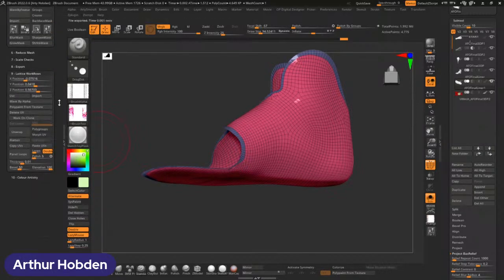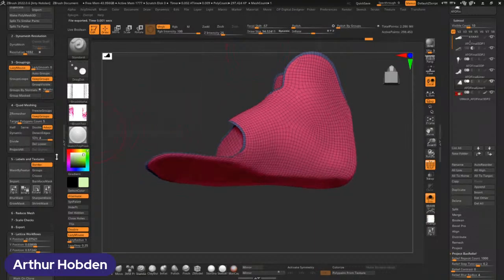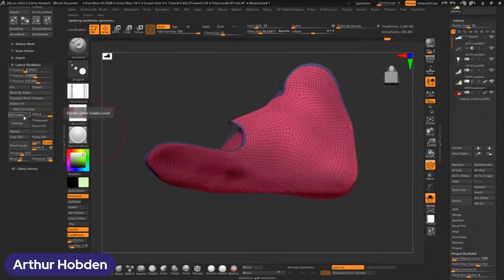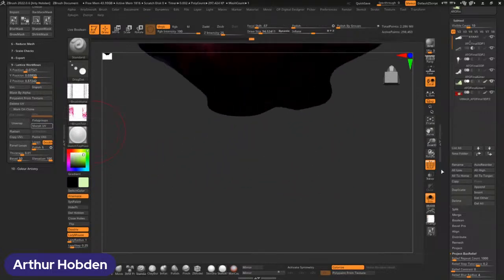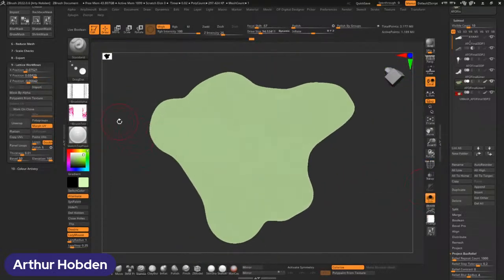So I'm going to copy these UVs. I'm going to divide this a few times. So now we have 298,000. And if I paste these UVs and then delete lower and then paste UVs and then morph this, same thing, we're getting that morph happening where it's all flat.